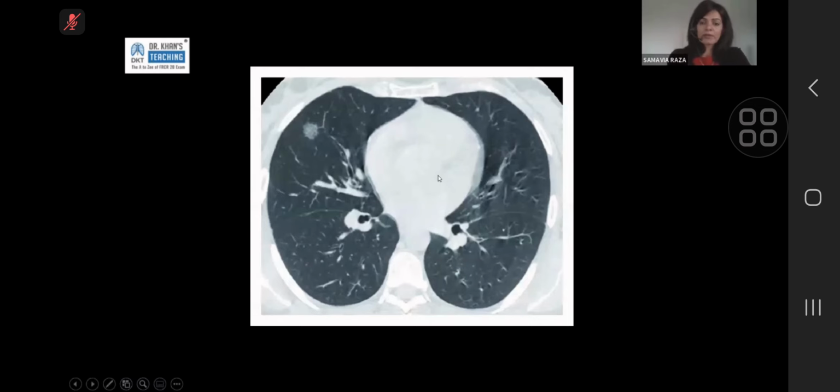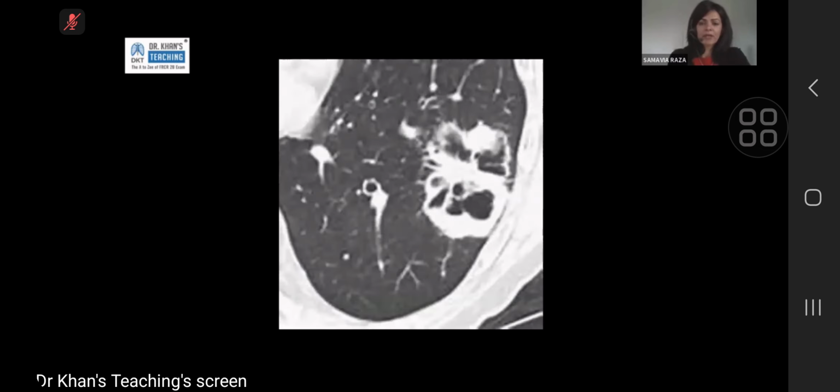And this is a purely ground glass lesion. Many ground glass nodules go undiagnosed just because some radiologists don't realize the importance of the spectrum evolving at any point. So this is a ground glass lesion that we would describe with size, slightly spiculated margins, and reported as something suggestive of an adenocarcinoma spectrum lesion. But this is clearly bigger than 8 millimeter.